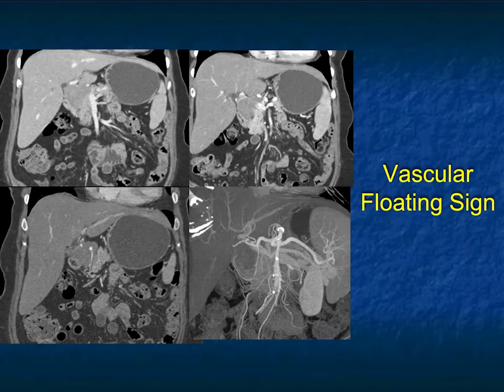And finally, just repeating that vascular floating sign. It's an interesting sign. I have to see if I ever call anything with that sign. And truthfully, I've heard of it, but never really followed it. But we are going to take a closer look at it because it has some value, particularly in these challenging liver cases. So with that, my time is up.